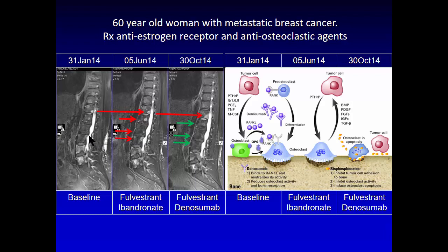And you can make the recommendation and say, look, this tumor is growing. You may want to think about changing the type of bisphosphonate. Go for a stronger bisphosphonate. So you can, in fact, intervene and say, try something stronger. Zoledronic acid would be something that was stronger, similar mechanism of action, but more effective, or something completely different, like denosumab. And in fact, the patient switches and keeps the primary treatment going, but switches to denosumab, and look what happens. So that one responds, that one responds, that one responds, and that one doesn't. So this is heterogeneity in response.